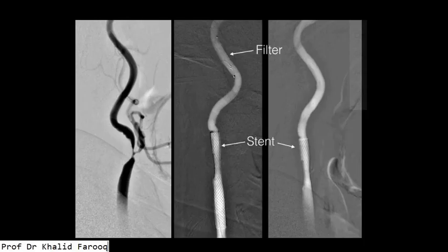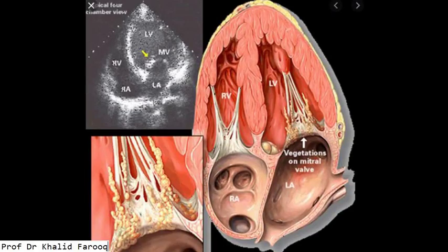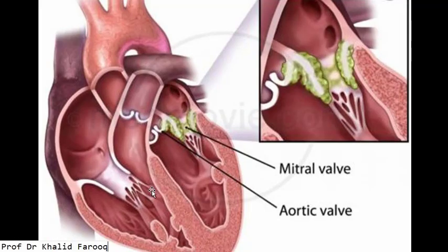Now we have to proceed on last portion of this discussion, which is assessment of cardiac vegetation with the help of echocardiography. Here we have a few examples, schematic diagrams showing multiple nodules in mitral valve, suggesting mitral valve vegetations. And this is the echocardiogram showing nodules, echogenic nodule in mitral valve. So these vegetation dislodges to the brain and cause ischemic changes.